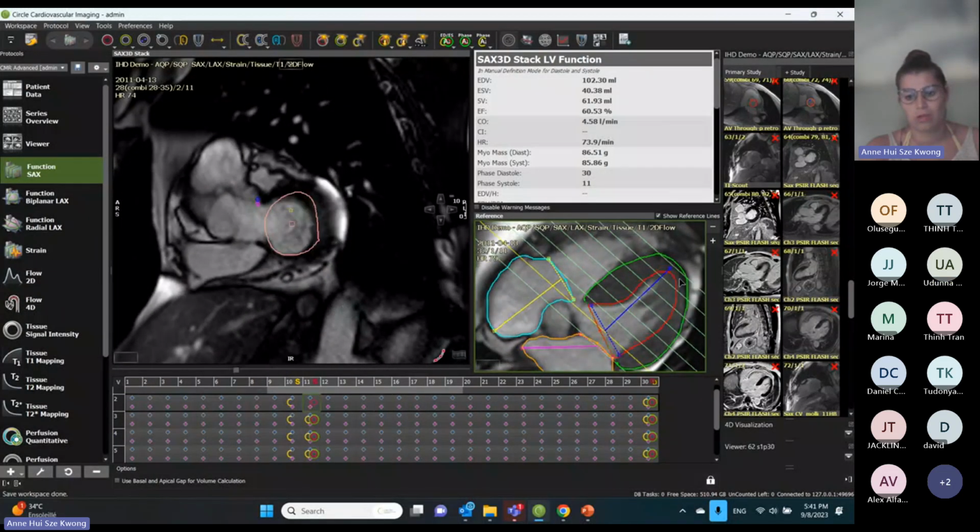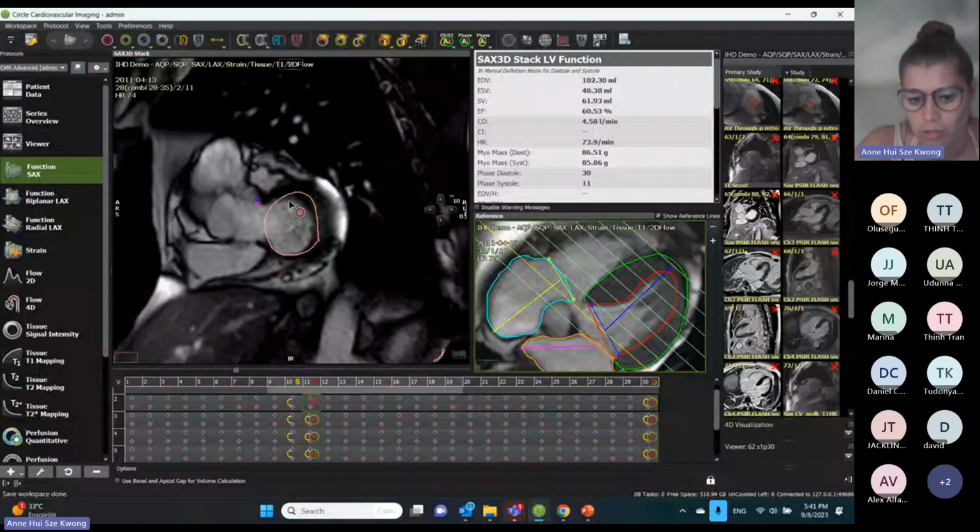So I can help myself with the long axis in order to know if I need to include a small part or a big part. If I have a contour, the contour will be used for the results. So this is my choice to put a contour; whatever I include in my contour will be considered for the results. Yes, so it's my choice.